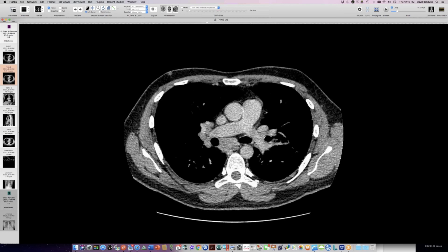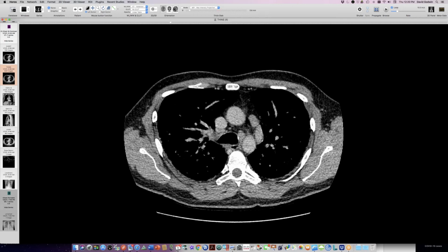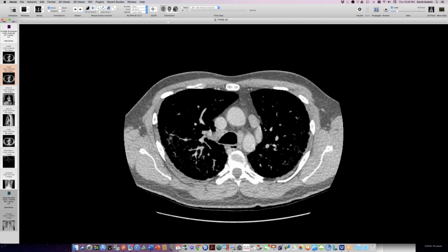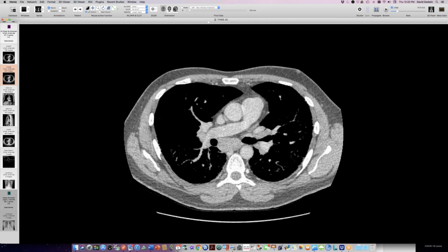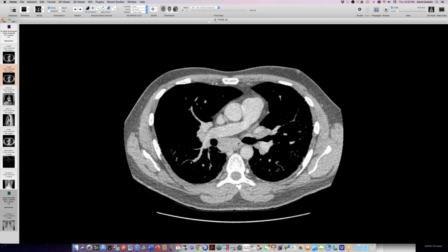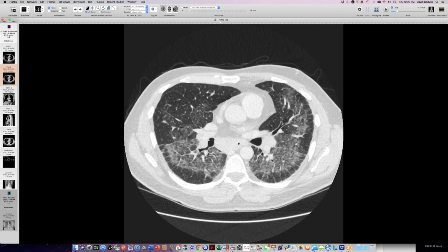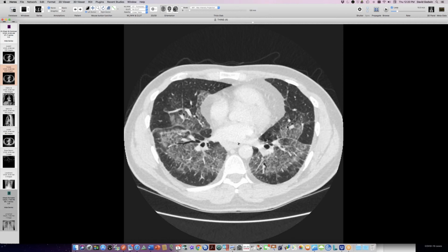The other thing he's got is a ton of lymphadenopathy, and it's sarcoid-like lymphadenopathy because it's very well-defined nodes with no blurring into the fat. So these are not soggy nodes that would go, say, with lung edema. They're very well formed, very crisply marginated. So this is just great for sarcoid. And we don't have older imaging to know how long this lymphadenopathy has been there. You think a guy with a diagnosis of ankylosing spondylitis would have had some sort of imaging. Maybe we can get a hold of that, but for now we don't have it.